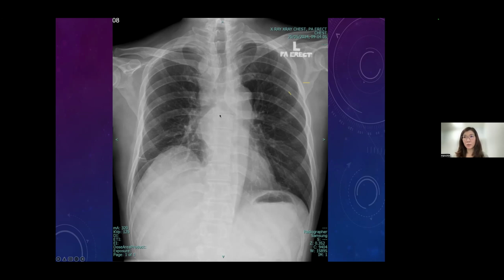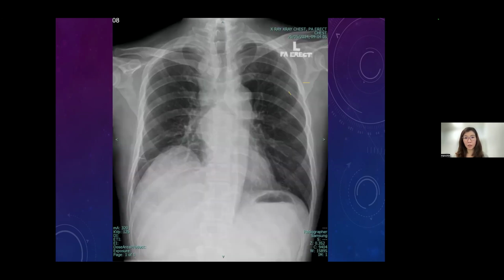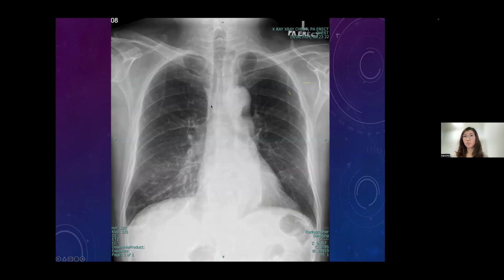The carina is not supposed to open this wide. Compared to this X-ray, you see the carina is not so widely open. Going back to our X-ray, you see this is a widely open carina, so there is a mediastinal nodal mass here. Remember, when I look at an X-ray, the trachea is also a review area, and the carina angle is widening. Compared to other pictures, the carinas are not that obvious, but this one is obvious.